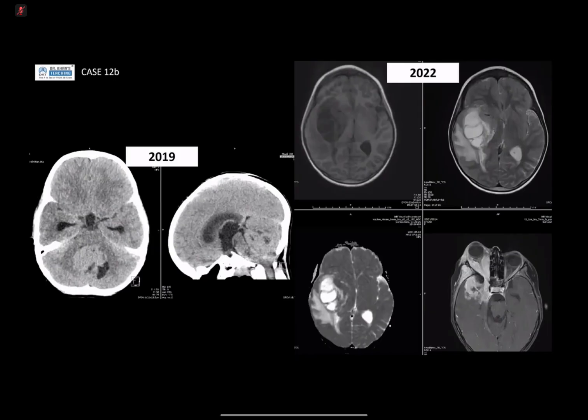Do you think that the lesion in the brain looks aggressive? How does that link to the lesion in the bone? If it were an adult, what would you be thinking? Is it a lymphoma? So a parietal bone lesion appears. If it had been an adult, with the temporoparietal lesion, I would have said it to be a glioblastoma.